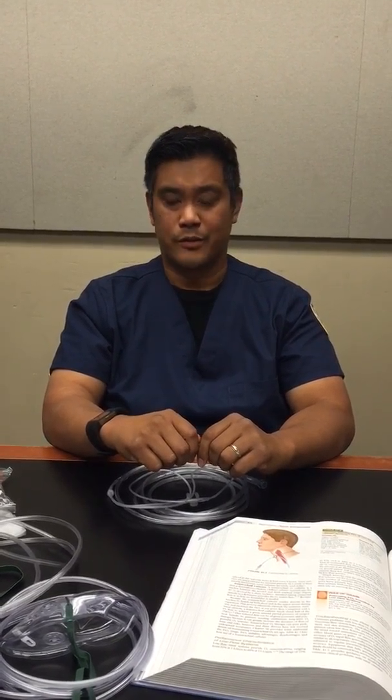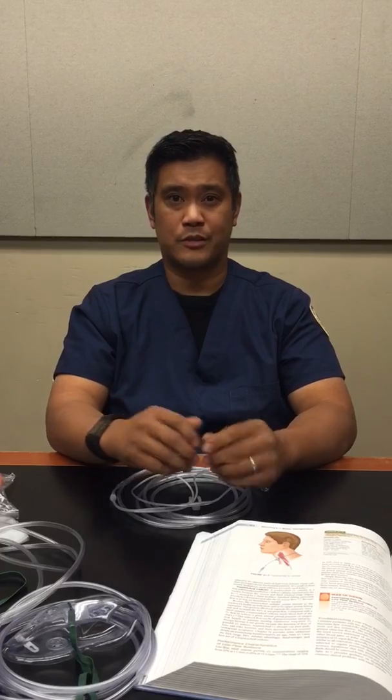The advantage to this device is that it has lower oxygen usage, therefore lowers the cost, and it does allow for increased mobility for the patient. The disadvantage is it's unattractive, it's cumbersome, it creates poor compliance for the patient, and it has to be replaced regularly. For best use, we're looking at home care settings for ambulatory patients who need increased mobility.